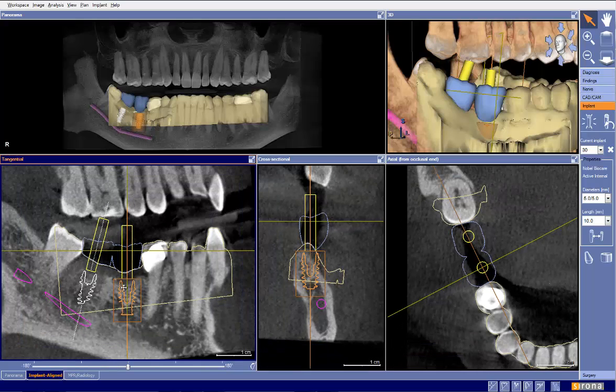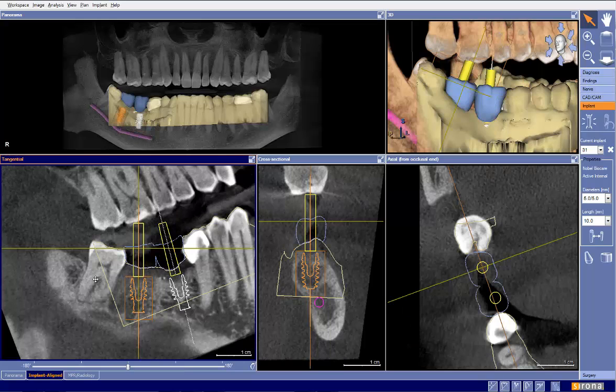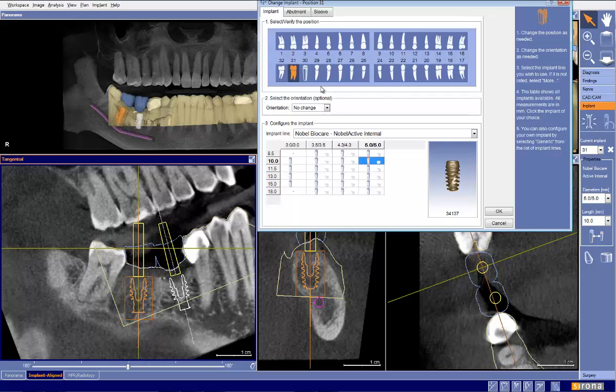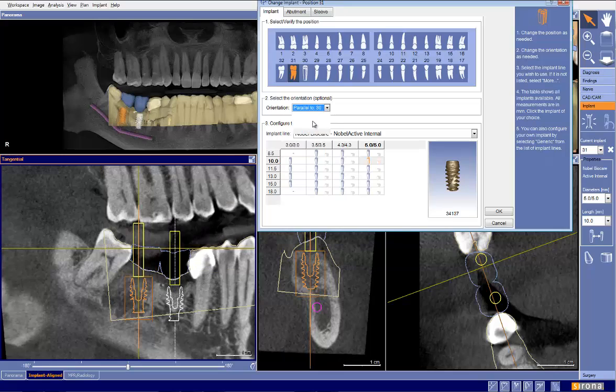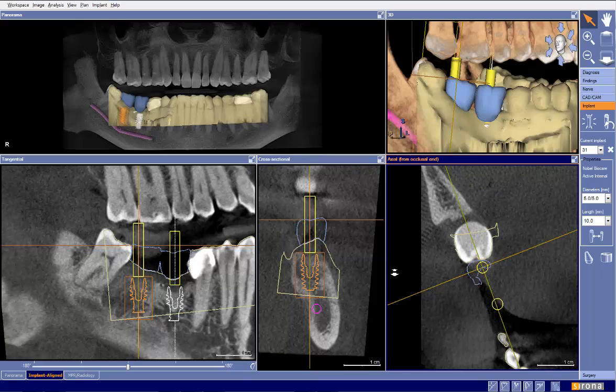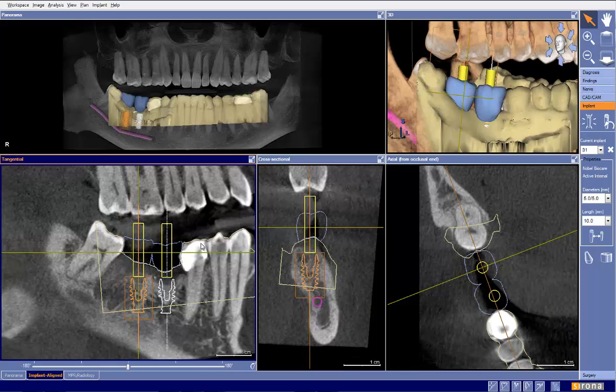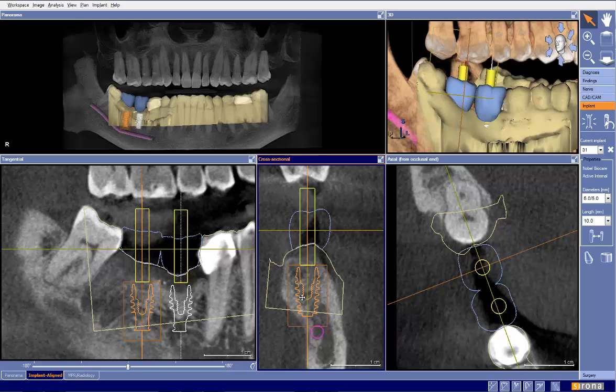By seeing tooth number 30 here, we're also able to see that tooth number 31 is definitely angled, the apex is angled to the distal. So I would also angle this over here. One thing you can do is go to the change implant button and ask the software to parallel that to tooth number 30. Now we've got an implant that's parallel. We're close to the distal here, looking at our axial view, so draw the implant and move it over, then bring it up to the bone level. And it looks like you did a nice job here grafting.